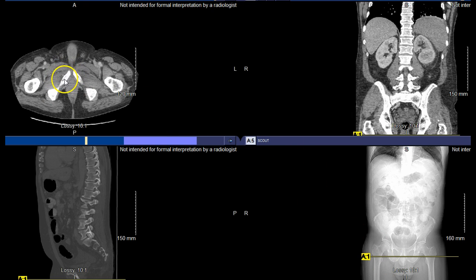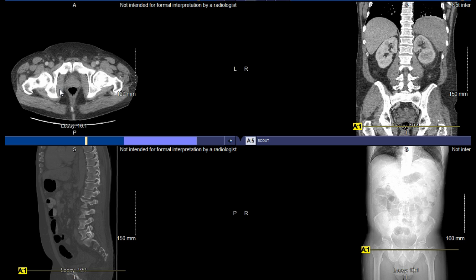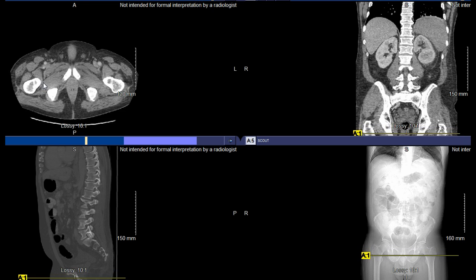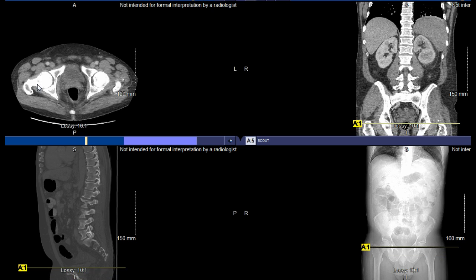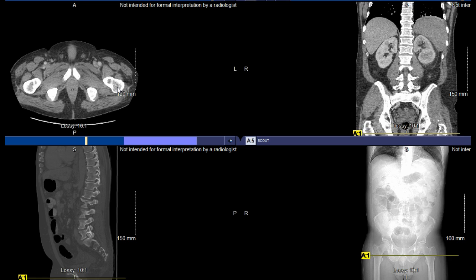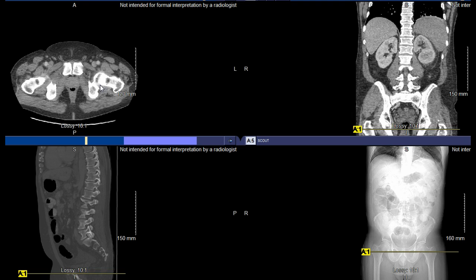On the anterior side, we may still be looking at the inferior ramus of the pubis here, but nonetheless, you can see the formation of that obturator foramen. You can see it's connected, it's gone, and it's reconnected. If you imagine it in 3 dimensions, you could see that circular process taking place there. Additionally, to focus on some of that femoral anatomy, we highlighted and emphasized the greater trochanter, and you can see it subsequently on the contralateral side, the left femur. As we continue to go down, we can see almost the start of the lesser trochanter being demonstrated there as well.